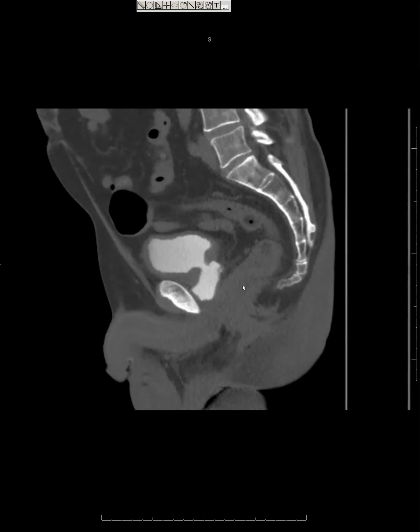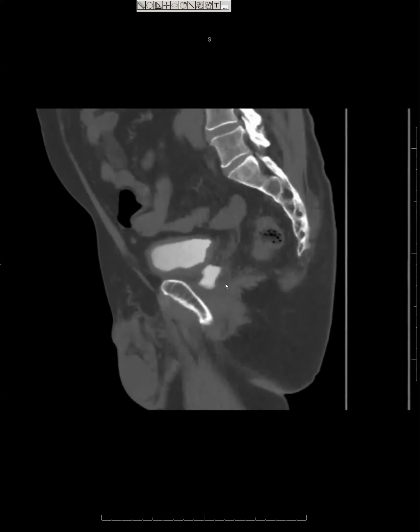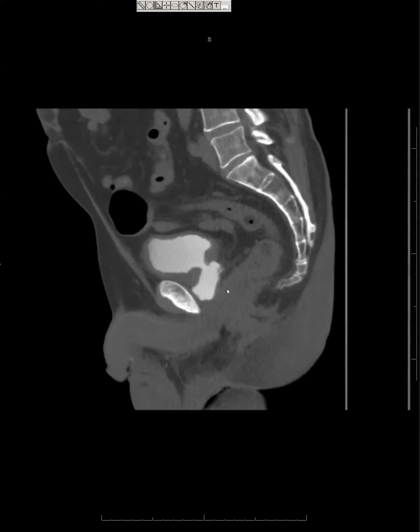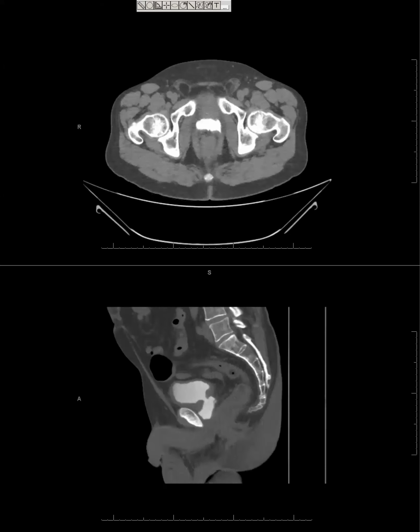That's an interesting thing that you just said, because there's a propensity for the urothelium to basically re-urothelialize or endothelialize. And so if it's nicely contained like this, it's probably got a lining that's very stable. What all they did really was put a catheter in. They threaded the catheter up, and then they might have tried to fill the balloon up in the bladder part and pull it down and tamponade it a little bit. But there was a follow-up.